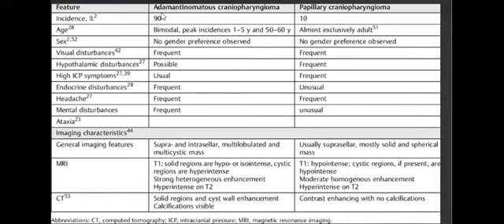They have much differential, but at least you can check the MRI and see the suprasellar and sellar component, and again the cystic appearance. The papillary type, which comes in adults, is almost like a solid mass. So when you find a cystic appearance, you go with the adamantinomatous type, and this happens in the pediatric age group, and it can also be bimodal. But the papillary type is almost exclusive to adults. Okay.